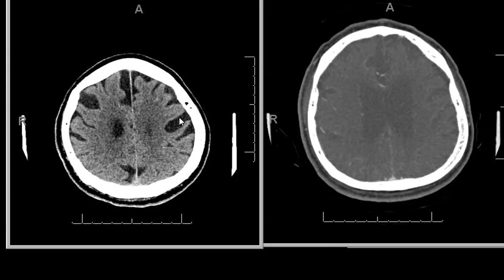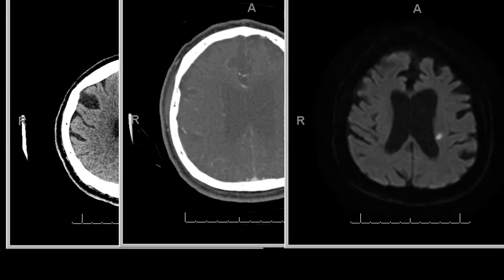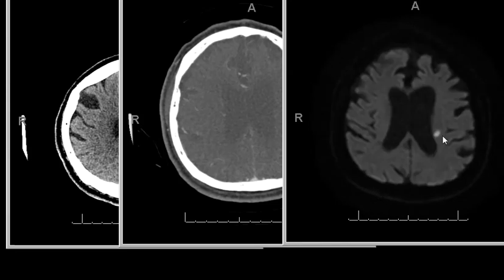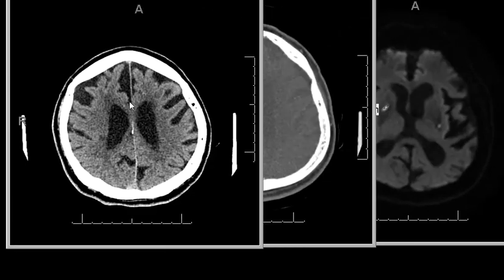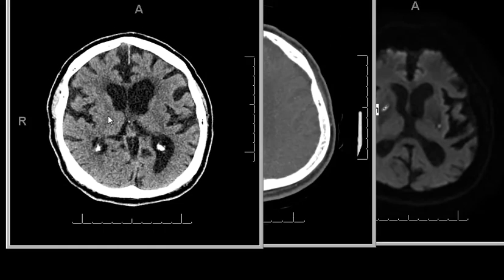here definitively, and later did an MRI on the same day. That's a small stroke exactly in the corticospinal tract, explaining the patient's symptom. And in the meantime, there's another one in the right side basal ganglia. Going back to CT, basal ganglia, that one is real.